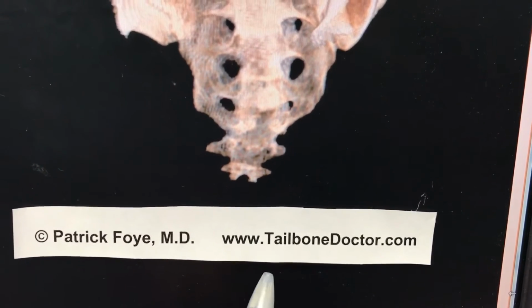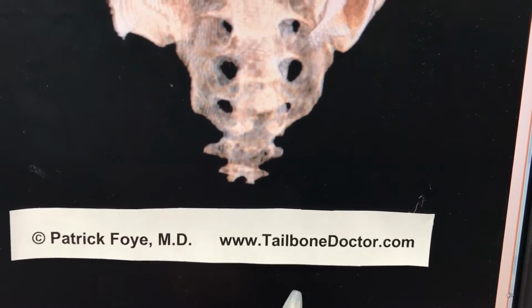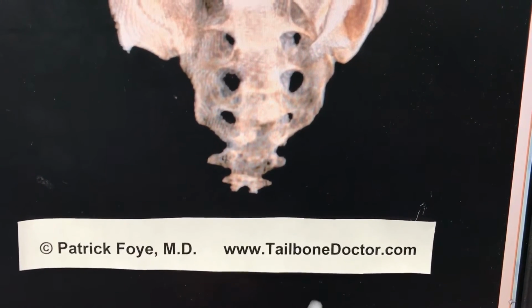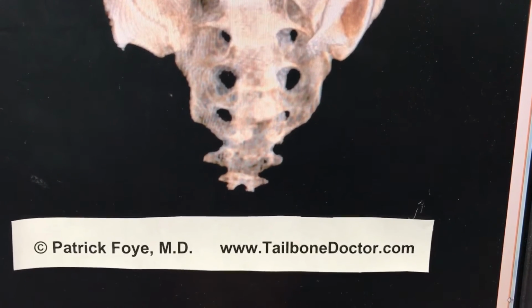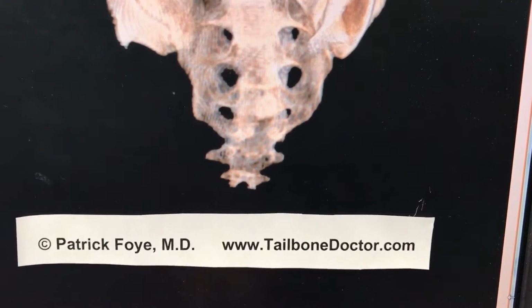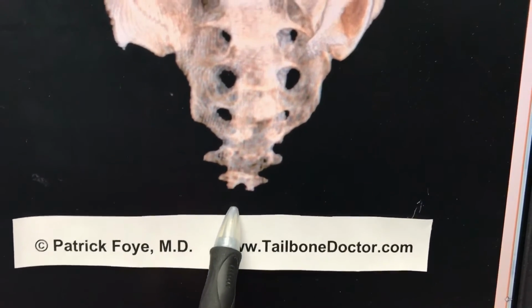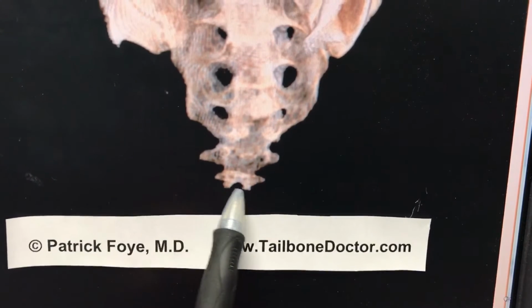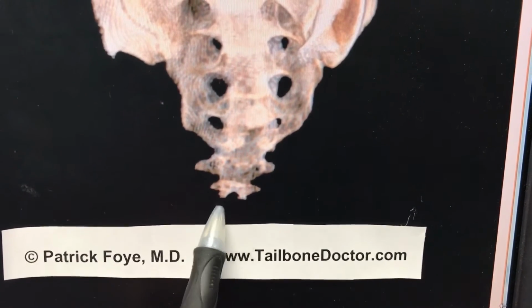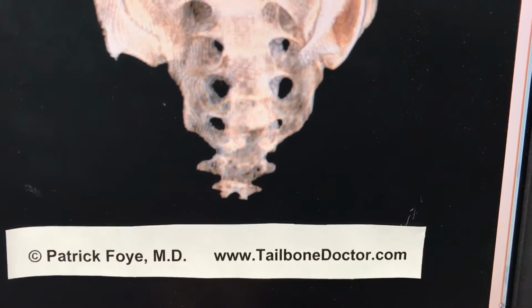So this is somebody who has what's called a bifid, B-I-F-I-D, coccyx, or a bifurcated coccyx is another name for that. That describes this anatomical variation where instead of the tailbone coming down to one single point in the midline, it splits into a point that comes down on the right and a point that comes down on the left, as shown here.